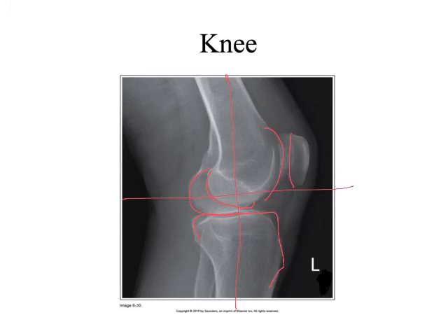We want to make sure that we have adequate contrast to visualize both bone and soft tissue, because sometimes we can see a little nick of bone or something like that with maybe some darkness around it. That would be evidence of an ACL tear. All right, that's one of the things that we can evaluate on a lateral knee X-ray.